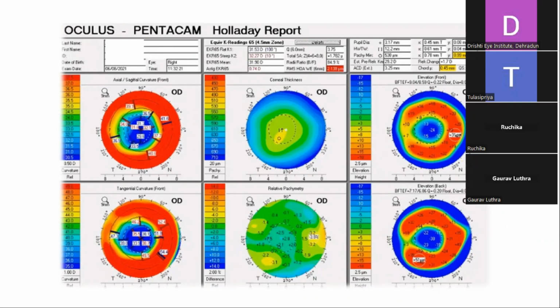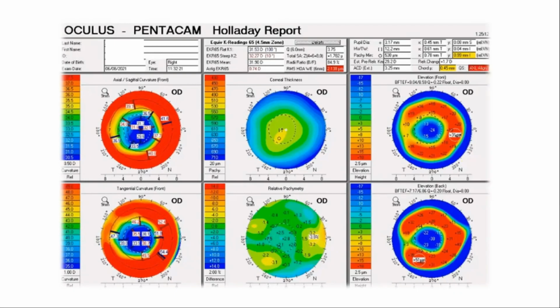So see, that's for refractive surgery eyes, for example, post RK and all, where EKR 65 becomes useful for some of our purposes. But what about regular corneas which are not operated or anything, and there can we utilize this kind of EKR 65 or the equivalent K readings?